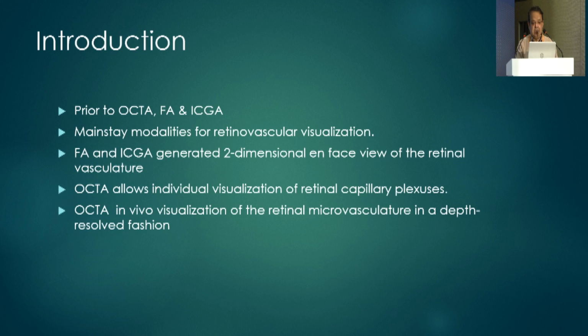FA and ICG generated a two-dimensional en face view of the retinal vasculature. OCTA allows individual visualization of the retinal capillary plexus. OCTA gives in vivo visualization of the retinal microvasculature in a depth-resolved fashion.